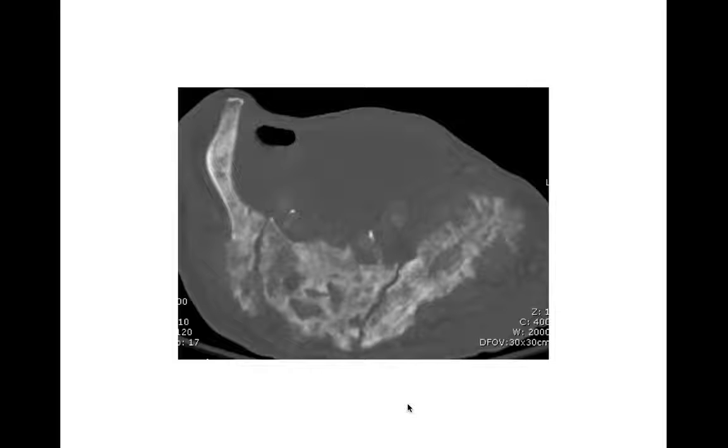All right, this one clearly looks scary. CT scan shows this hair on end periosteal reaction along the iliac bone, and there's this diffusely infiltrating sclerotic lesion throughout the sacrum and the left iliac wing, and partly into the right iliac wing, and there's a soft tissue component associated with this. So again, an example of a very aggressive appearing periosteal reaction. When you think of differentials, I don't think any benign things are really going to be on your list. So in this case, it was a malignant degeneration from Paget's disease.